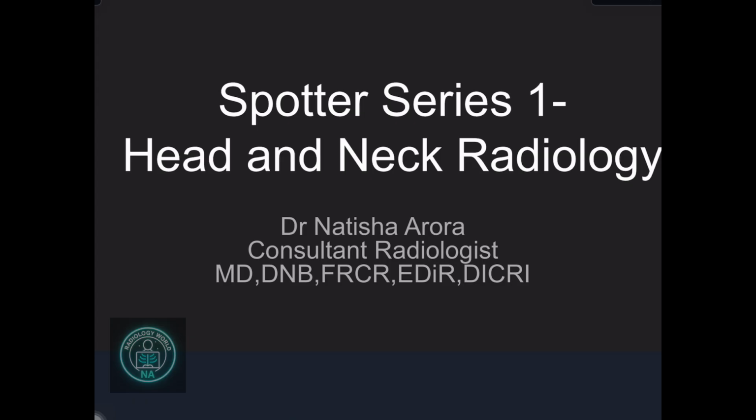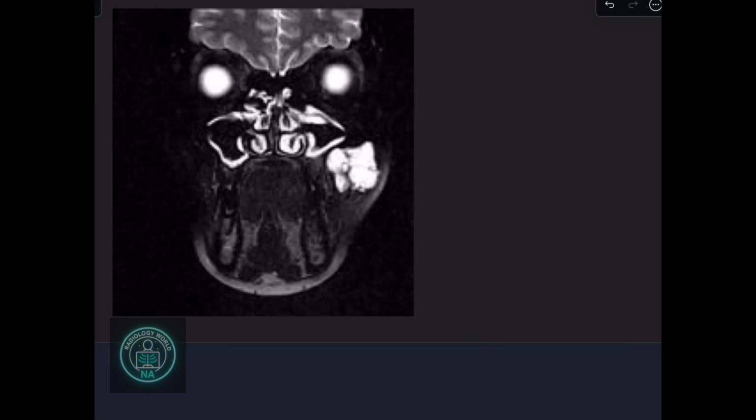I am a consultant radiologist based in India, and today I will be discussing head and neck radiology spotters, which are very commonly tested in your radiology residency examinations and also in competitive examinations like FRCR and EDiR. These are spotter series with 10 important images. You can pause the video as I show you the images, think about the diagnosis, and it will be followed by a brief description. So let's start with image number 1.